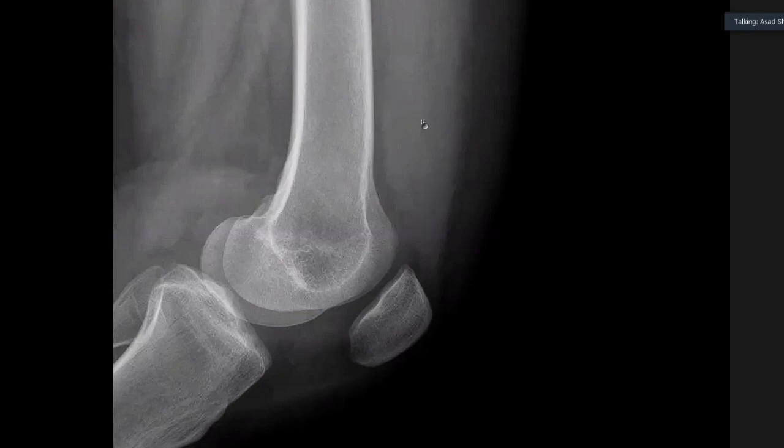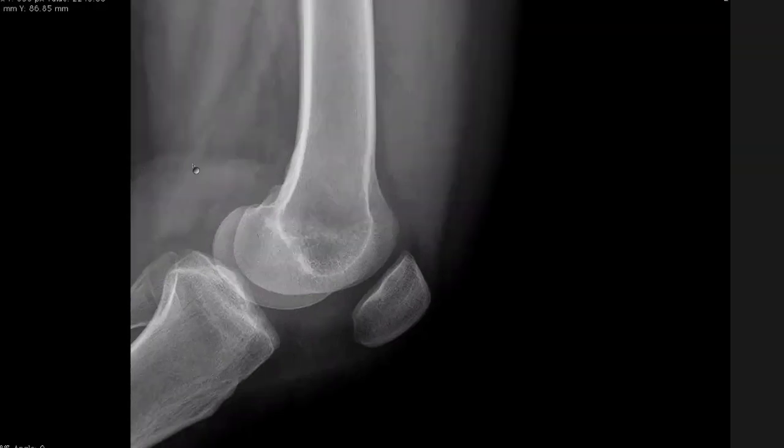Most likely, on X-ray you would just say this is probably an effusion, or it could be soft tissue. So it could be a traumatic hematoma. I mean, there's no history of injury. So it's an atraumatic unilateral left knee swelling in a young guy. If I give you that history, what's your differential? Unilateral atraumatic knee swelling. It could be due to an underlying malignant process, or a joint-based process.